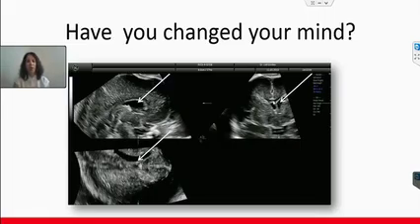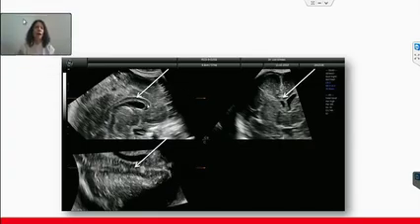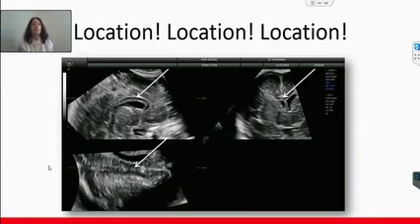If we want to see the corpus callosum, we have to grab the dot and put it on the corpus callosum. So let's do it. Now we put the dot on the corpus callosum and you get the corpus callosum very nicely here and here. Just a minute. So the issue is location, location, location. You use the 3D information in order to work with aligned images, not oblique ones, and to know exactly where you are in the volume, in the space.